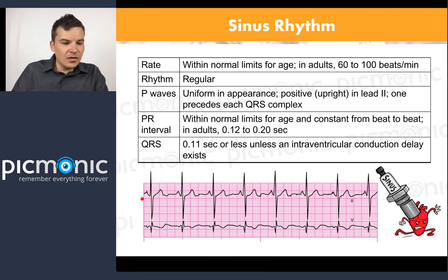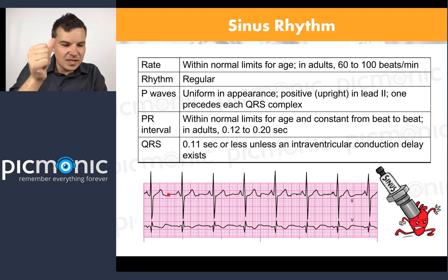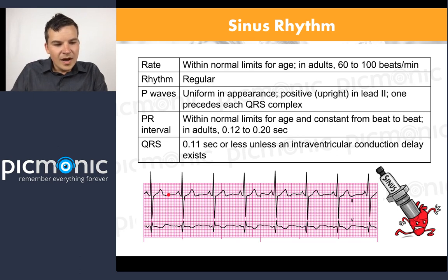Getting back to our regular, look at our P. So I take my beautiful thumb again, the best thumb in the world. I mean, I know thumbs. There's no thumb better than this one. Magical thumbs. Then I put it down there, and I'm looking at the distance again. When I look all the way across, they're very close.